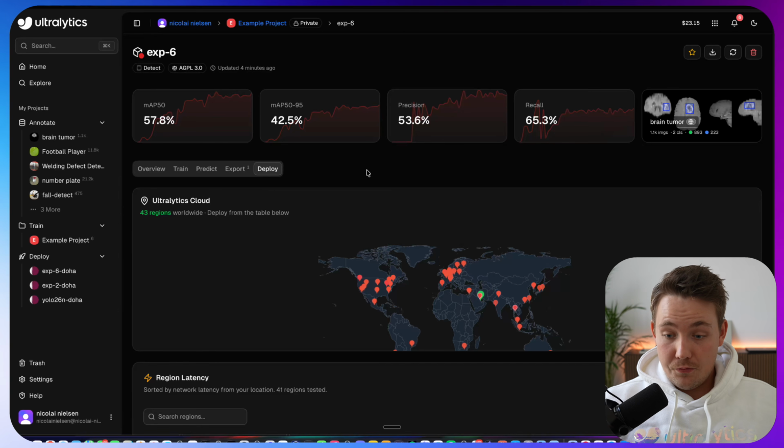This is the whole Ultralytics platform. You can do every single step in here. Definitely go in, check it out, test it out on your own dataset.